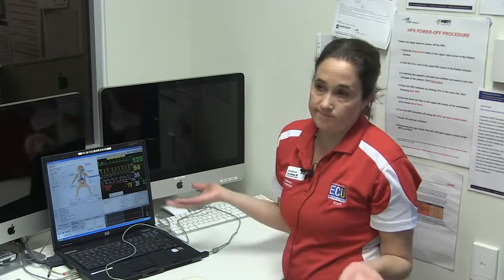And you can do simulation well with a very low fidelity mannequin and a very high fidelity mannequin.